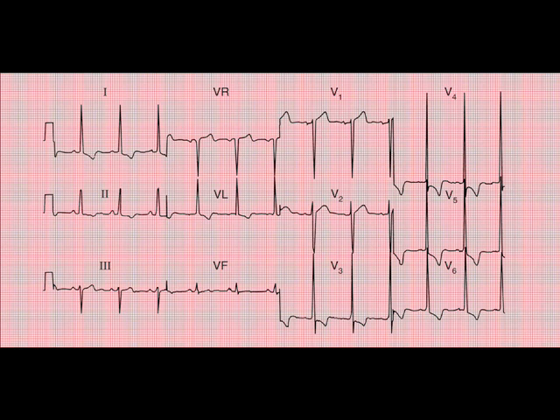So we can measure the PR interval. We can see that it falls within 3 to 5 small squares, or 3 small squares, 1 large square. There is 1 P wave per QRS complex, so that's good. We can then look at the QRS complex, beautifully sharp and narrow, very, very nice indeed.